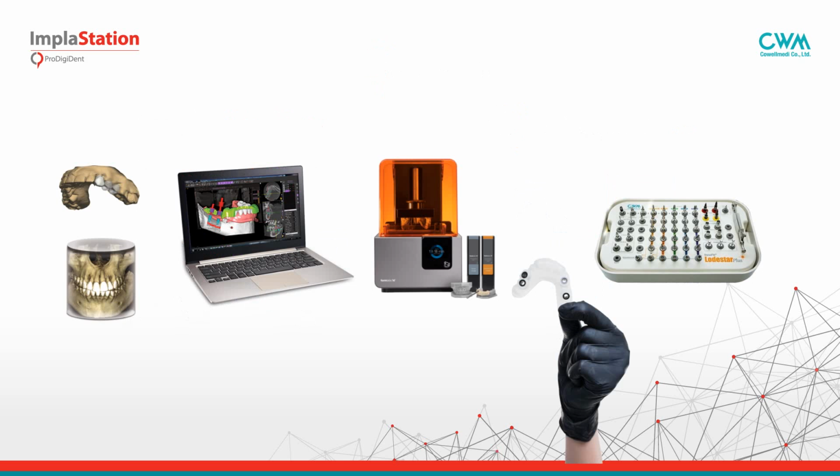This picture shows the full workflow and some equipment for performing guided surgery treatment. On the left of this picture are CBCT and optical scanners. Basically we are interested in the diagnosis results. The next step after obtaining them is 3D treatment planning, then 3D printing of a surgical guide, and the last one, surgery with a special drill kit for guided surgery.